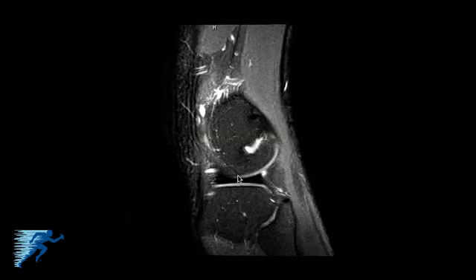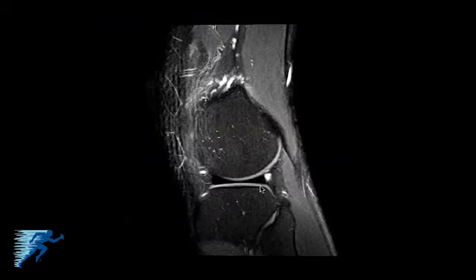see more of the cartilage surfaces as we get deeper within the joint. This is the lateral gastrocnemius tendon on the outside of the knee, and we're starting to see more of it along this part right here. Now we can see the more cup-like area of the meniscus attachment with the posterior horn of the lateral meniscus and the anterior horn of the lateral meniscus.